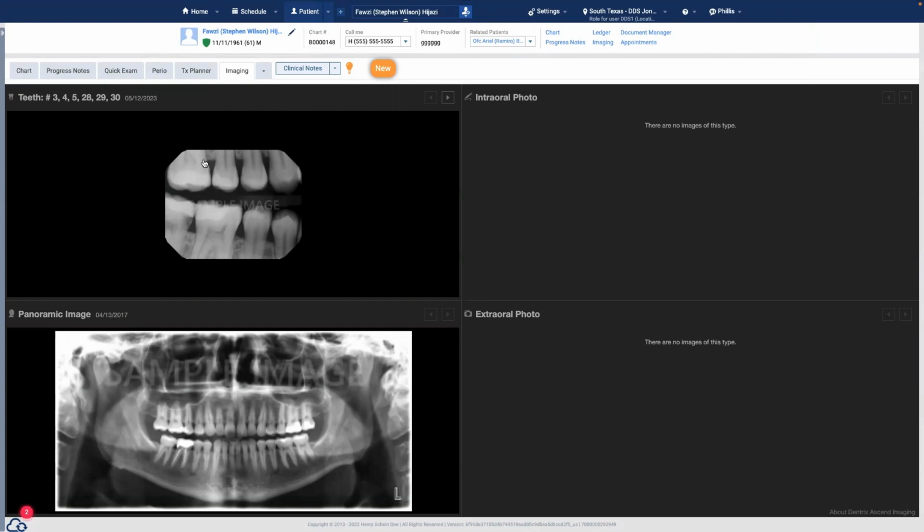Yeah. And Adam, if you don't mind, I want to interrupt you in the middle so I can point this out to people who are watching or listening. You're full screen now. This is basically a Chrome window, right? Google Chrome web browser, and this is a window within it. And as you went from the schedule to the patient to the x-ray, nothing else opened up. You're still within the same window, correct? Yeah, well said. Exactly. Same window. I didn't have to open a different tab or anything else.